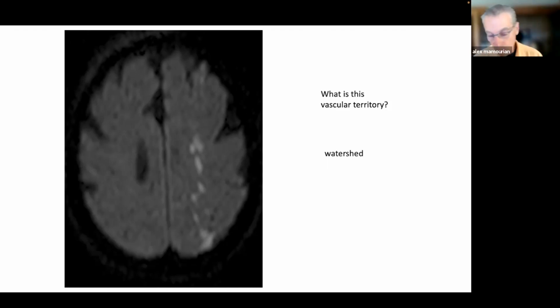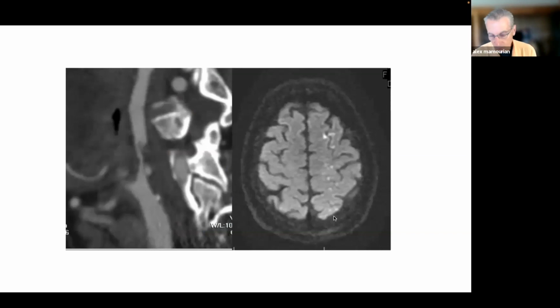So the same notion goes on here, that there's insufficient flow to provide enough blood flow to this in-between territory, this so-called watershed territory. So you get this pattern of infarction that involves both the cortex and the intervening white matter. And it tends to form kind of a big loose C when it's from all the way from front to back. So again, it doesn't involve the ACA or PCA territory, nor the MCA territory. This is an in-between pattern of infarction. Here's another example. You see the cortex is involved here in a line between territories from this high-grade 90% carotid stenosis of the ICA.